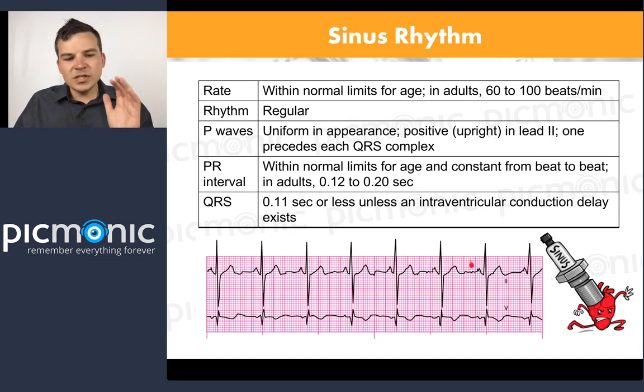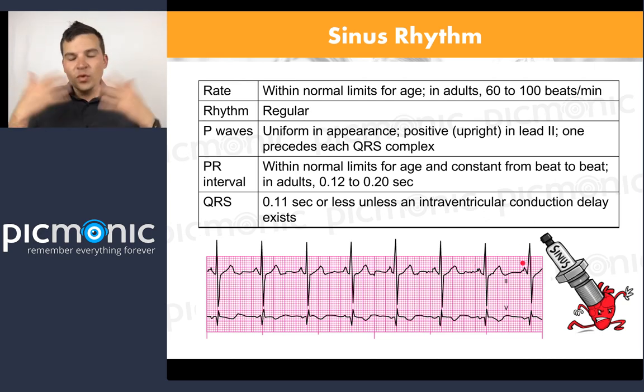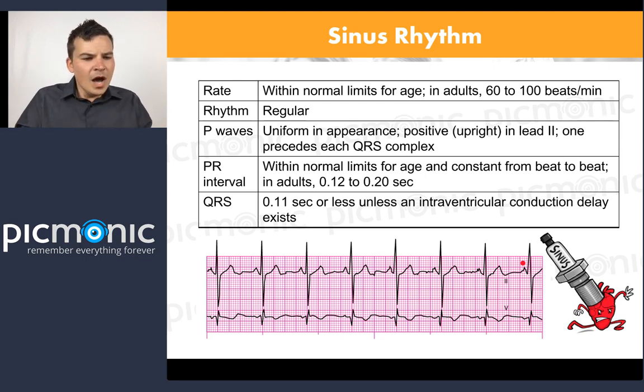And I'm doing this one slowly on purpose because you're going to have to be able to do this, and it gets harder. Of course it gets harder. That's the whole point. That's why this is a difficult subject. But the important thing here is that you've got to understand the basics. So this is the normal rhythm. I'm telling you it's normal. And when we look at harder ones, then you're going to have to figure it out.